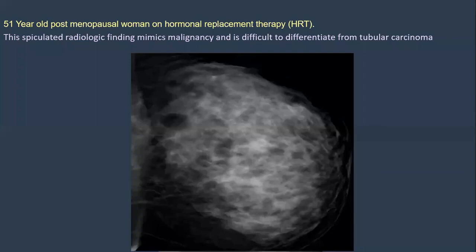I can see it posteriorly at the center. Do you mean this? No, this is part of the parenchyma. The most dense area. Excellent. Where? At the middle. Yes.